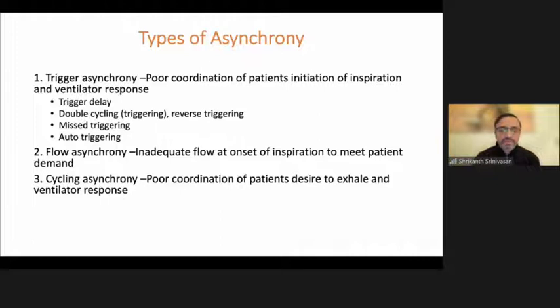Then we come to cycling. Cycling means transition from inspiratory phase to an expiratory phase. When there's a poor coordination of the patient's desire to exhale and the ventilator's response in the form of opening of the exhalation valve, then there can be cycling asynchrony. Effectively, the patient wants to exhale, but the ventilator is still continuing in the inspiratory phase, or the exhalation may be premature.